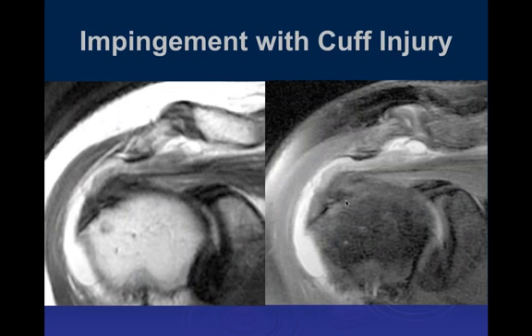So that's eburnation, and you can think of a saw. When you get an irregular surface of the acromion process, as the tendon rubs up and down, if you have a smooth surface, you're not going to get much irritation. If you have an irregular surface, you can saw right through the log. So this irregular surface is an indication that you have increased risk for impingement.